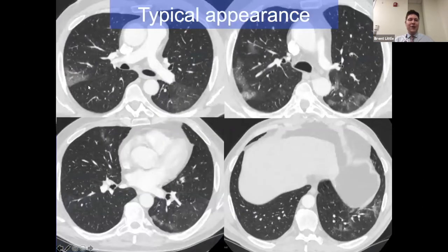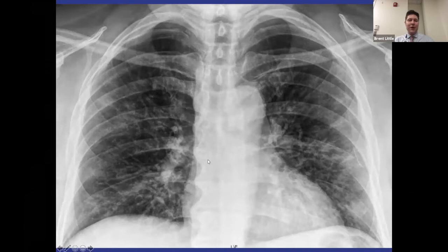And here's another patient with a typical appearance of COVID-19 at CT. You can see the multiple, somewhat round, peripheral, bilateral ground glass opacities here. We'll talk about how this appearance is certainly nowhere near 100% specific. But here's a radiograph showing the typical appearance of COVID-19, especially in the intermediate to later phase, where you have bilateral hazy opacities with some areas of more confluent round opacity bilaterally.